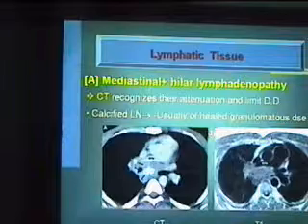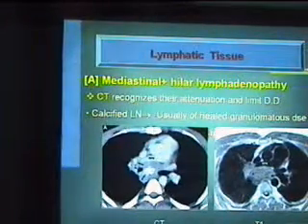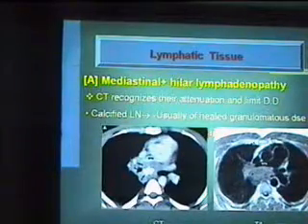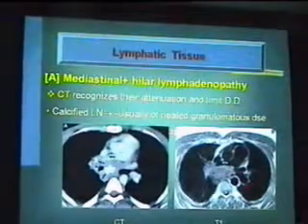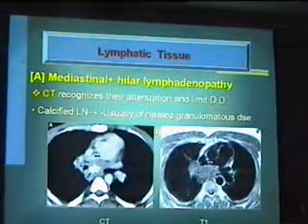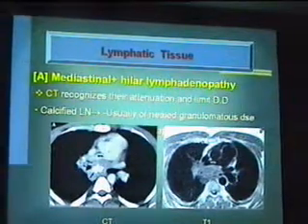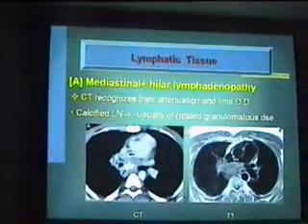The presence of calcification هيحط لي granulomatous lesion يعني تي بي في بلدنا طبعا، ممكن تبقى ساركويد في شيزا ميدل ايج فيميل والقصة معروفة. اوكي. وده الام ار اوف ذا سيم بيشنت. شايفين الكالسيفيكيشن is not apparent. اوكي. فيمكن ده بيساعدني اكتر ان انا في السي تي يعني ان انا اشخص granulomatous rather than neoplastic.